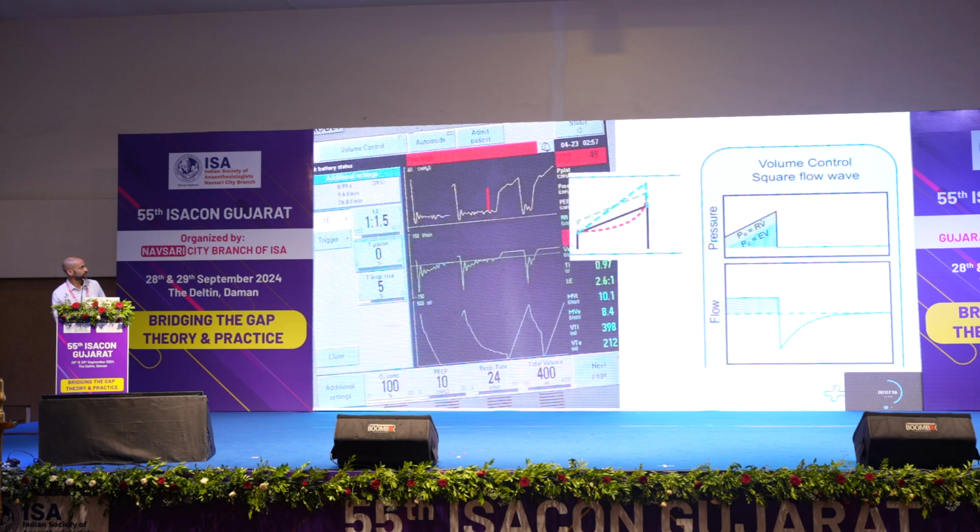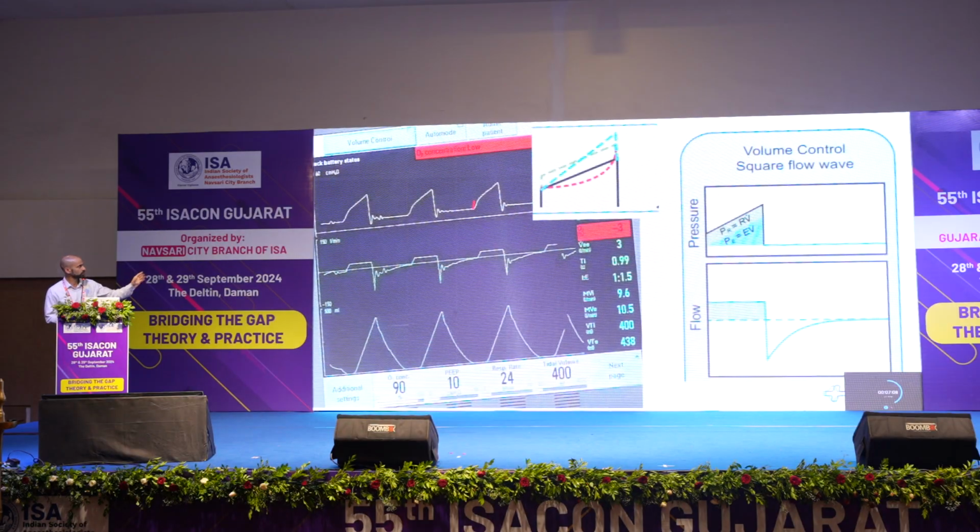So you can look at the consequences here. What we did for this patient is we removed the HME filter which was blocked, a fairly easy fix. And this is what we show, that step up comes down. So your resistance has come down, but it's not gone away completely. This patient still has COPD. So look at the expiratory load, it's still not reaching the baseline quickly.